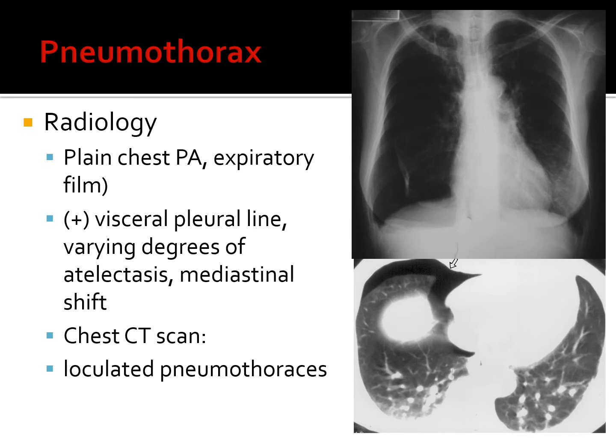But in some cases where pneumothorax is highly suspected and is not seen on an inspiratory film, an expiratory film is requested. In the expiratory film, the chest volume decreases so that the pneumothorax will show itself if it is not seen on the inspiratory view.